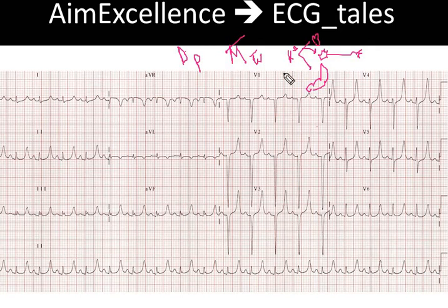It can lead to many other findings in the ECG, like prolongation of the PR interval, flattening of P waves, broad QRS, and the most dangerous finding is the sine wave pattern.